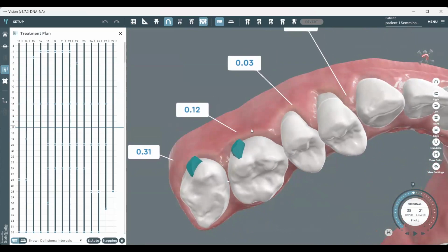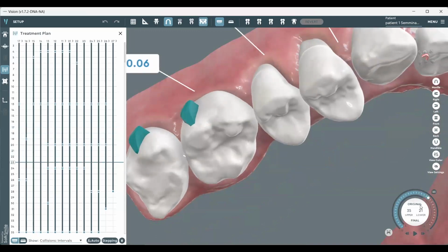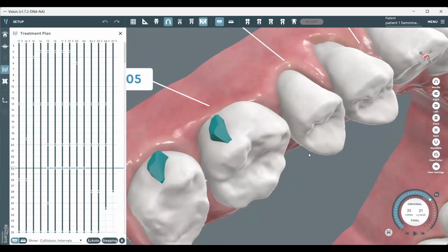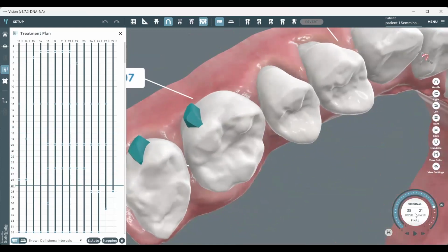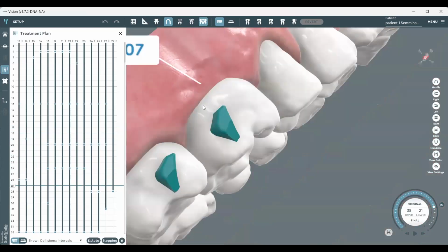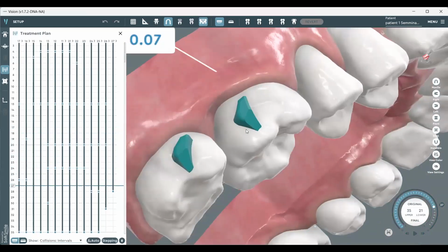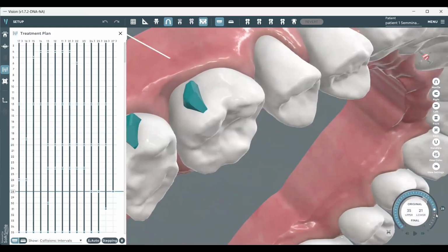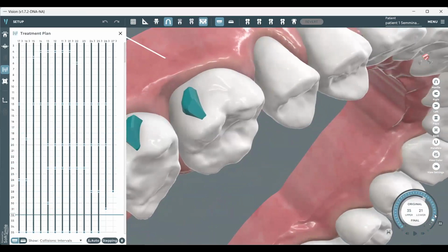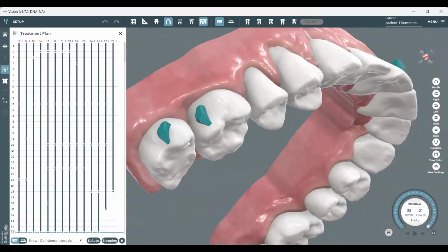That is why attachments are so important, because if we create pressure here, we will need to create pressure also in this part. And then at that moment that the mesial out is done, the attachment can have another active surface to create pressure for the distal in. You can see there. So that is why I use, in these complex cases, multi-plane attachments.